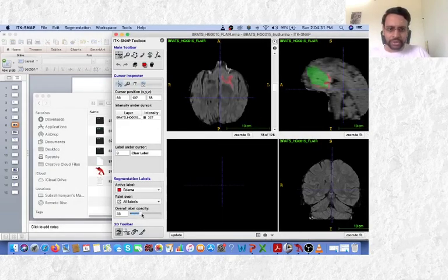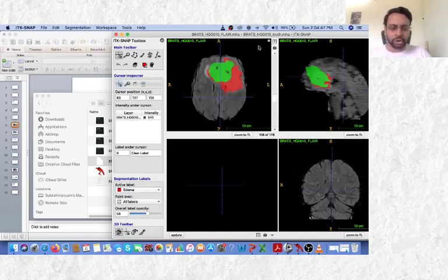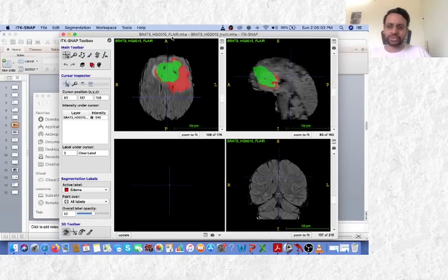Those are the masks of two labels. One is edema and another is referred to as active tumor. You could overlay them on this image, and then you could in fact control its opacity. And if you want to make an editing of these labels also, you have this label editor, so you could do that as well in this tool.